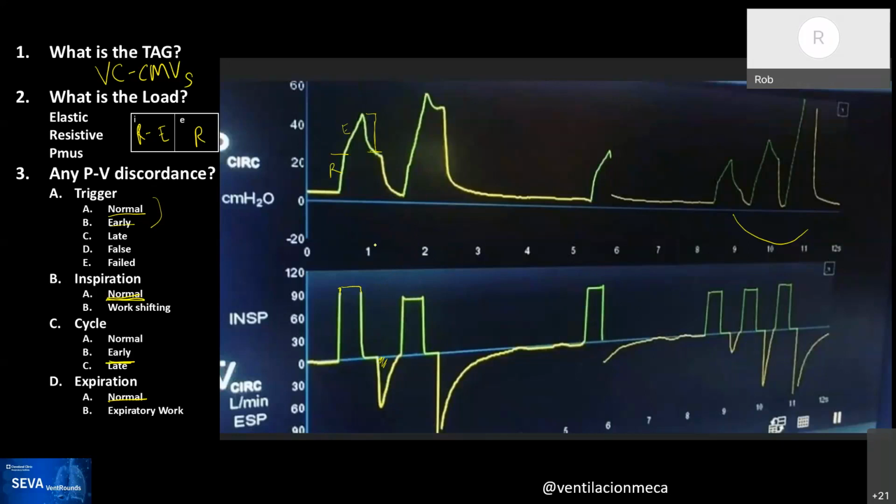First of all, when we say set point targeting for volume control, simple set point targeting for volume control, we are saying that you set a flow or an inspiratory time and a tidal volume, which ends up being setting flow and tidal volume. And we say that the ventilator doesn't do anything automatically. And from a macro point of view, that's true.